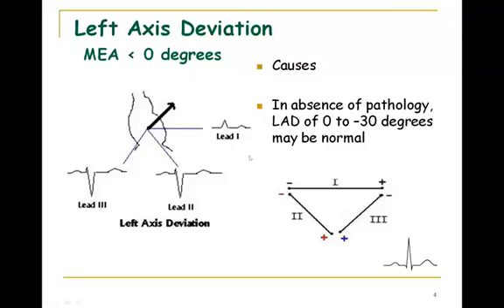If you look over here, Einthoven's triangle. Here is standard limb lead 3. The negative recording electrode is placed on the left wrist. The positive recording electrode is placed on the left leg. Remember EKG rules again. If the vector is running towards the positive recording electrode, you're going to see an upwards deflection. If it's running towards the negative recording electrode, it's a downwards deflection. What do you see here? A big downwards deflection.